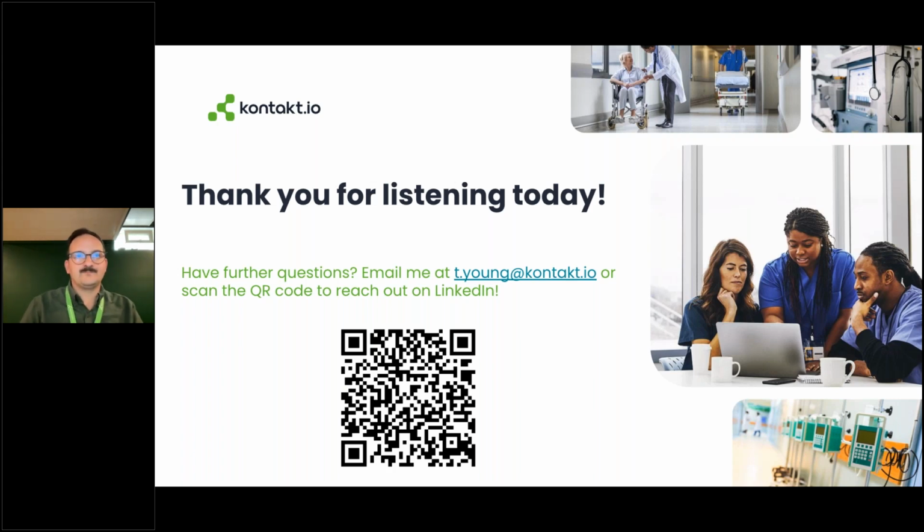Right. And then you touched on this during your presentation, but how does AI factor into healthcare and RTLS systems? Great question, and one of the more exciting ones. One is the Ask AI feature that I showed, where we're using artificial intelligence to understand the question being asked, make sense of the data set, and then give you an answer that makes sense for a human.